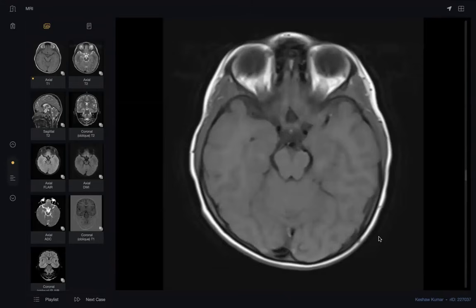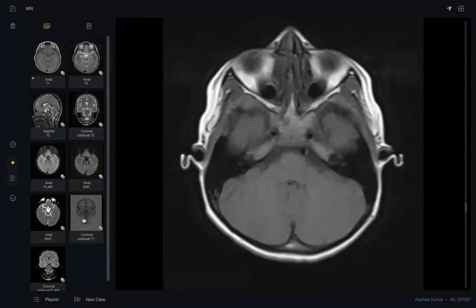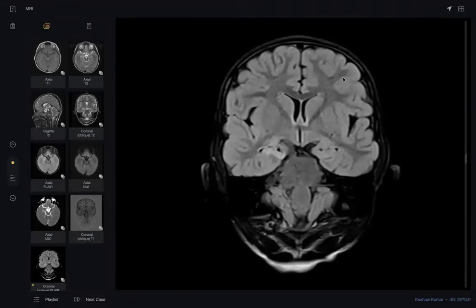So can I look at the FLAIR images? Yes, sir. One second. Can I help you? One second. Yes, sir. This is FLAIR.